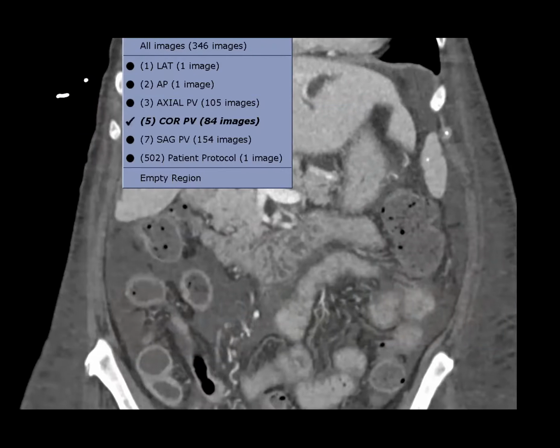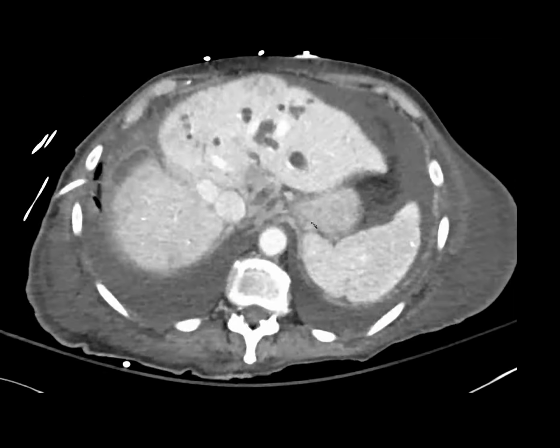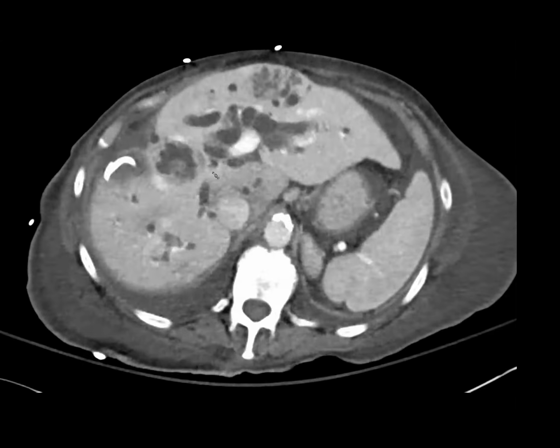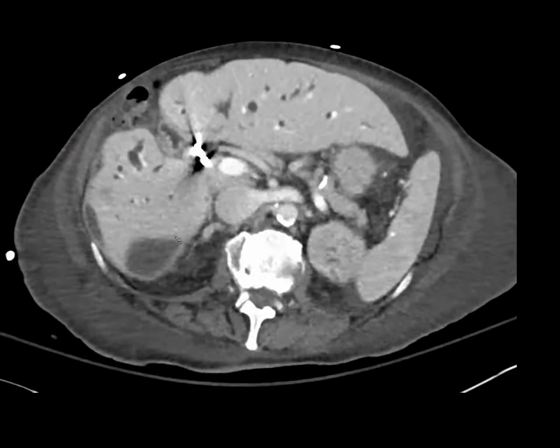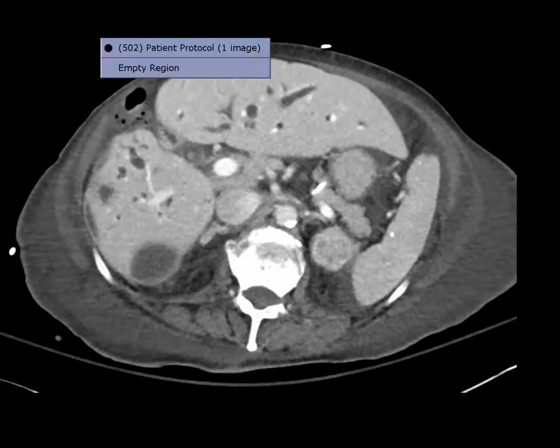Okay, this I just pulled up. Actually, it's a companion case to Anu's case. I just thought it was kind of cute. This patient has a cluster sign, hepatic abscesses, biliary dilation, but then they had this kind of stuff here, this kind of looked like soft tissue. I'll show you the coronal.